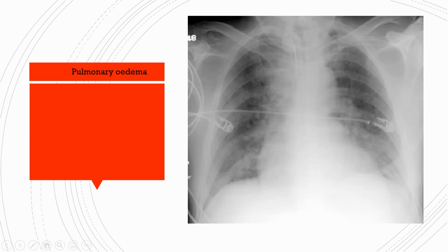Someone said something in the chat. How do you know it's not a problem with exposure? That's a good question, but to be fair, actually, this one is a bit underexposed because can you see the vertebra behind the heart? No, you can't. So very well pointed out by this person in the group chat. I'm not too happy with seeing the vertebra that well behind this heart, so it's probably underexposed as well. But if it was underexposed, it would be white, but it wouldn't show some cotton wool aspect.